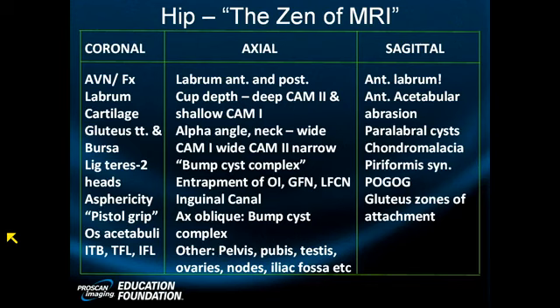I'm not going to classify labral tears for you right now. They have been classified arthroscopically. There is a radiographic classification, and I don't find this very helpful. What I do find helpful is what we're about to do, which is describe what's a degenerative tear, what's a traumatic tear that's stable, what's a traumatic tear that's unstable, what's a traumatic tear that can be repaired, what's a traumatic tear that requires resection. And with that, let's look at some cases. If you're so inclined, you can certainly look up the Czerny classification system.